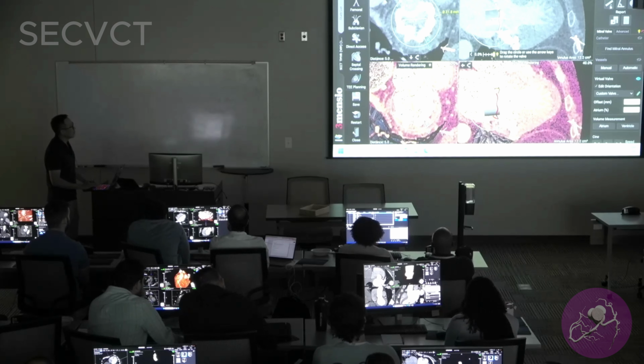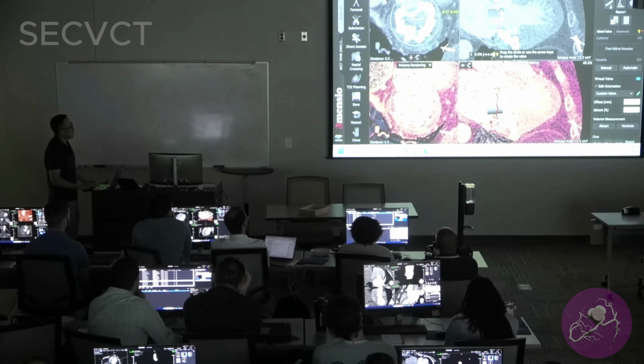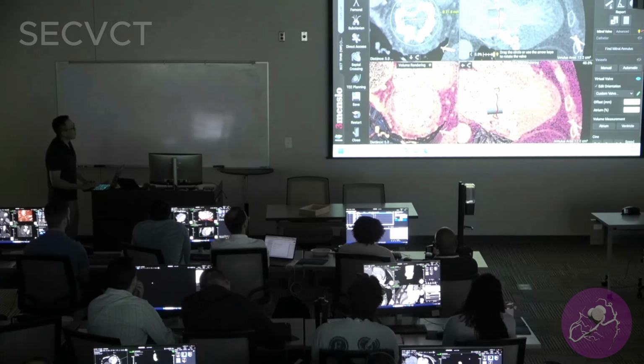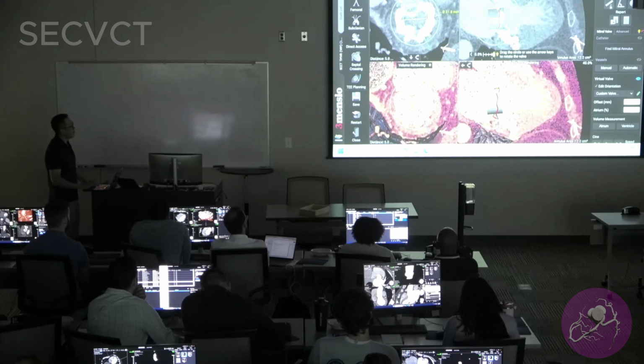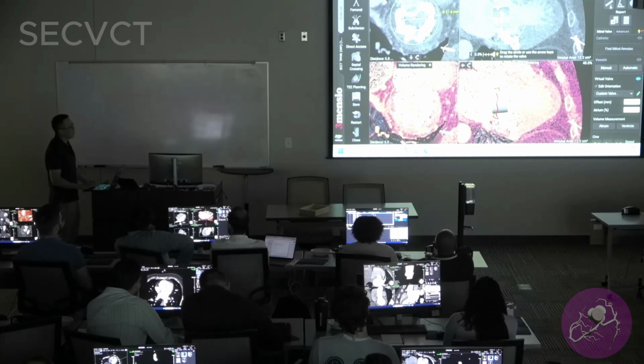If you are too deep in the ventricle, what you're going to risk is what we just talked about in the last case, obstruction of your LVOT, right? Like this is completely blocking off your LVOT. If you're too shallow, you see this pink line right here? That's what's called the skirt of the valve. This is otherwise a bunch of open cells in these stent frames. If you put the valve up here where the pink line is not touching your MAC, you're going to have leak through these open cells and you're going to have paravalvular leak. So you have to put this thing somewhere where the MAC is touching the pink line, but you're not closing off the LVOT. And again, this is not exact science, right?